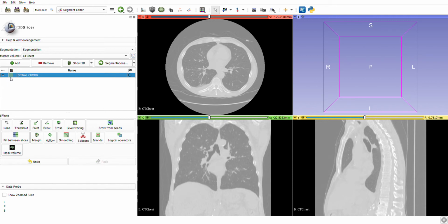Now besides that, you can see there is a green color given over here. Whenever you do the further process, the entire views will turn into the green color. For easiness, in order to differentiate between the different tissues and body parts, I will choose a little brighter color. So upon this green color, if I double click, I get the options to choose different colors. From here I will select this red color.